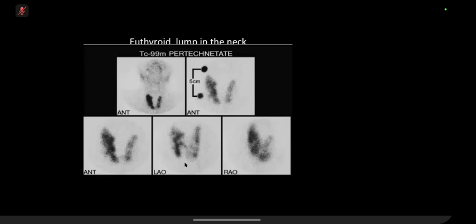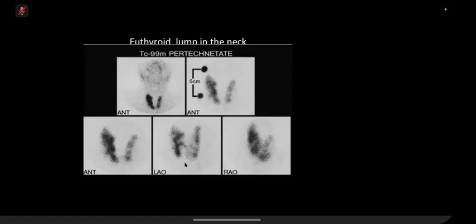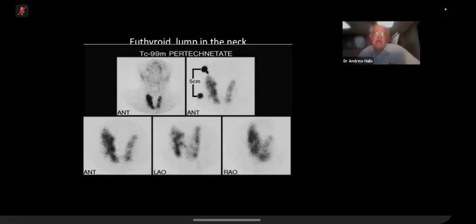So there looks like there's asymmetrical increased uptake in the right thyroid lobe. It doesn't look very diffuse, more sort of nodular. Yes. So whether this could be maybe a multinodular goiter or multinodular process? That's right. So we've got a big gland. I mean, it's more than 5 centimetres top to bottom, and it's patchy areas of increased and decreased uptake on both lobes, maybe a bit more on the right, but in both lobes, that's likely to be a multinodular goiter.